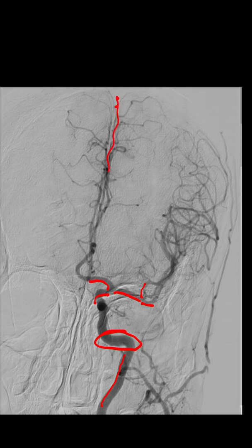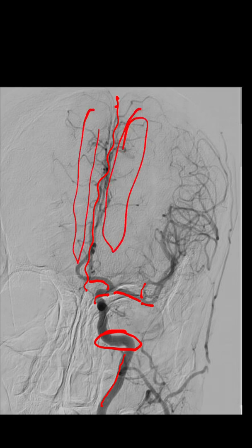You can see that normally, suppose you cut here, this is the center portion. Normally, if it is supplying only one half, only this ACA territory should be filling. Here you can see that it is crossing to the opposite side and filling the opposite side also. That means the ACOM is present here, part of the circle of Willis, and this A1 is supplying the ACA on both sides.